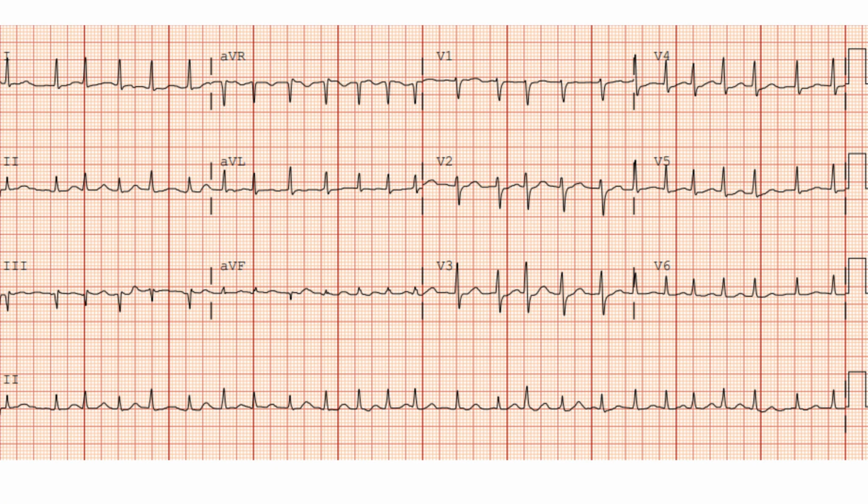So let's get into his EKG. Here's his first EKG. Again, pause and take a look at it and write down what you think. Again, on here, we have multiple abnormalities. The obvious one is, the rhythm is definitely irregular and fits with atrial fibrillation. It's a little fast as well.